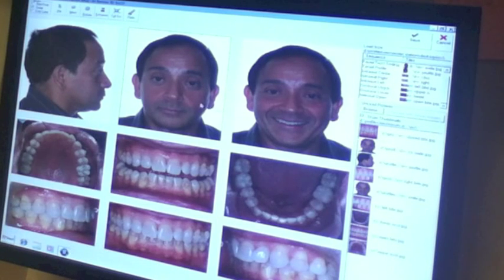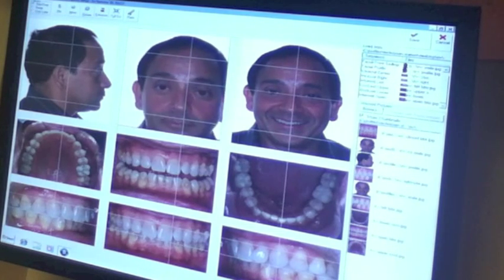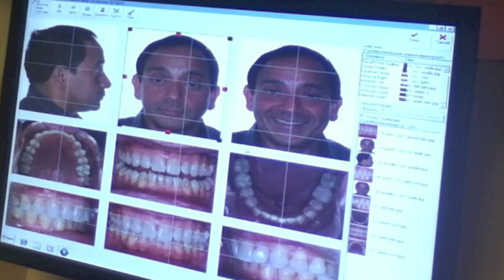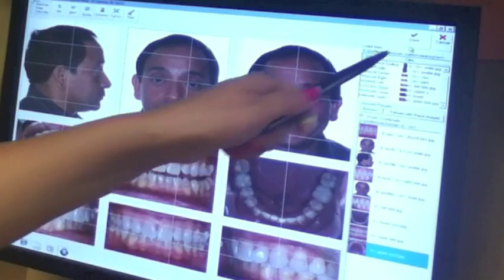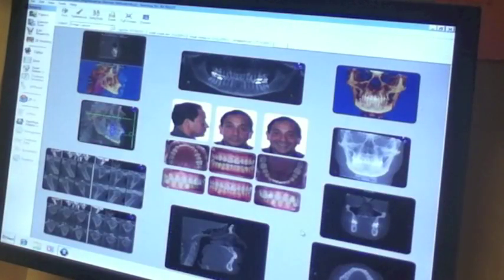These are already edited and cropped, but to do so, you'll choose the size crop option at the top, and you can take your arrow to drag it to make it bigger or smaller, however your doctor prefers you fit it in the squares. When you're all finished editing, you can hit save, and your Dolphin template is complete.